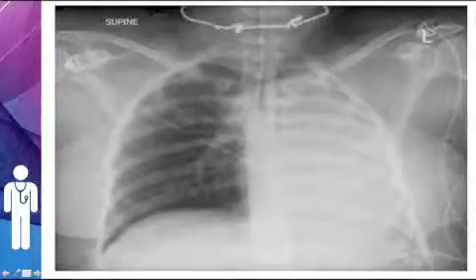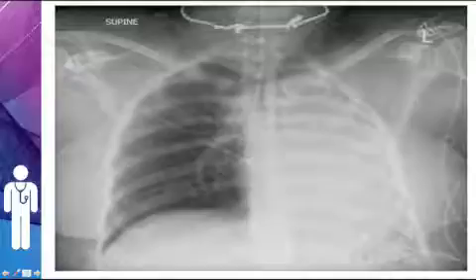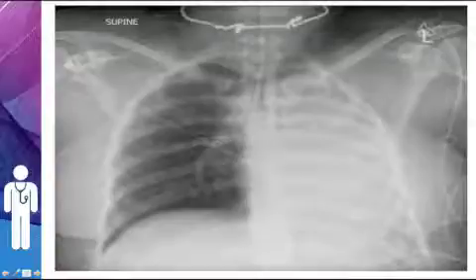There are a few lines to pick out here. You've got zipper clips, some ECG dots. I'm not quite sure what this is here, but there's a foreign body of some sort, possibly the gastric tube coming down. It's hard to say whether it's gone back up into the chest though. And then the endotracheal tube seems to be pointing down here. So it's quite possibly a right main bronchus intubation, but it's also possible something's going on here pathologically.